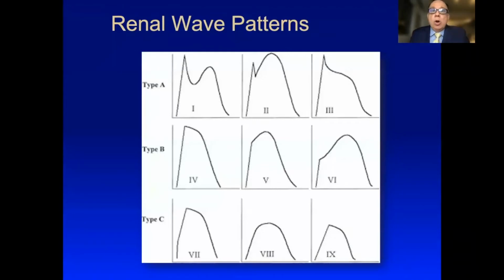It is important we all remember that we have different renal wave patterns. Those patterns, type A and type B, are normal. But here the lesson is that we have to place the calipers properly. We have to place one caliper at the end of the diastole and the second one on the peak of the initial wave, independent of the morphology of these patterns.